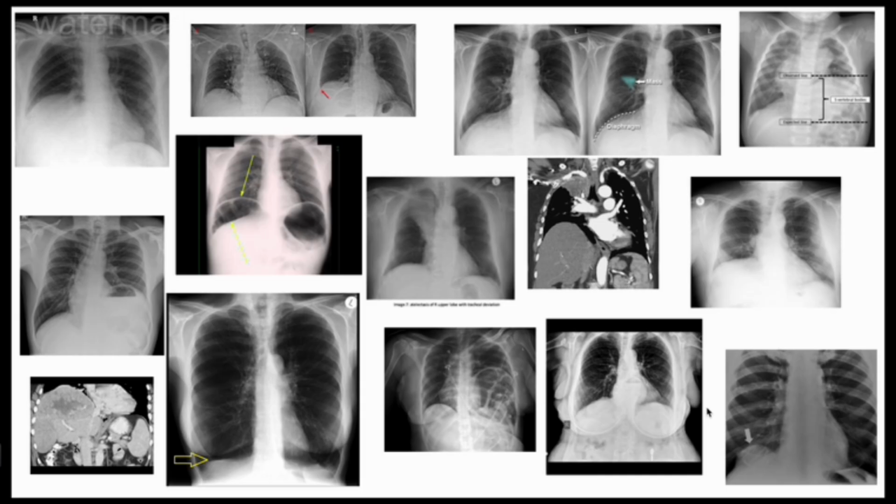So when you look at the radiograph, after looking at the wall, you looked at the pleura, it's very important that you look at the hemidiaphragms. Are they flattened? Like in this case, they are usually flattened in conditions where we have air trapping, like in those chronic obstructive airway diseases. Or is it raised?